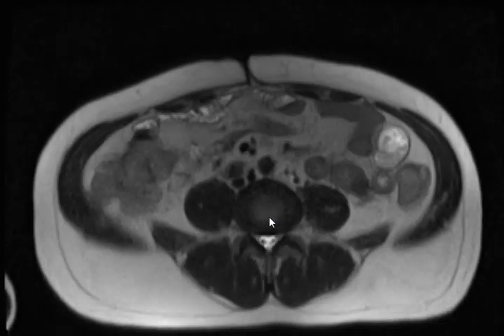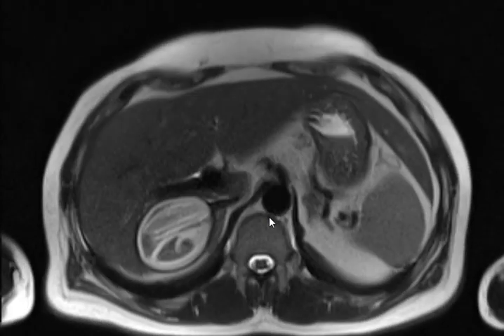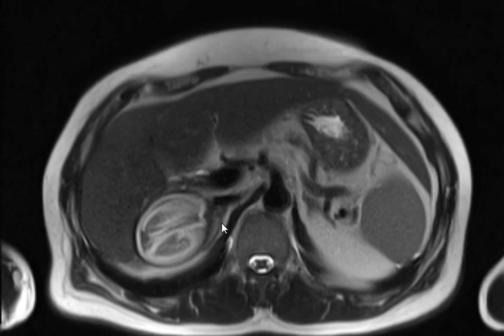What are the signs that help you to decide this is a lesion arising from the liver? Claw sign. Where is the claw sign? This. The partial volume, you are at the top of the lesion. Is there a claw sign here? No claw lining. Okay, what else?